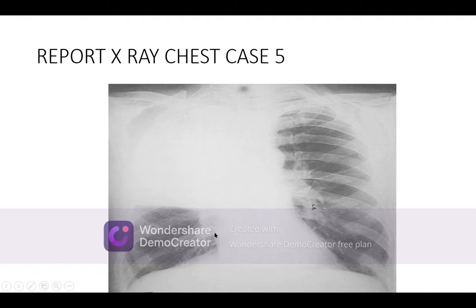The lower part of the middle mediastinum is visible only. Upper part is not visible. So the size is concerned, of the heart is concerned, lower part. It is normal limits. This is the border, although it is not a smooth border, it is a straight one. Describe this border, left border, and describe this border, this one, although it is blocked here. And the upper part of the middle mediastinum is definitely not seen.